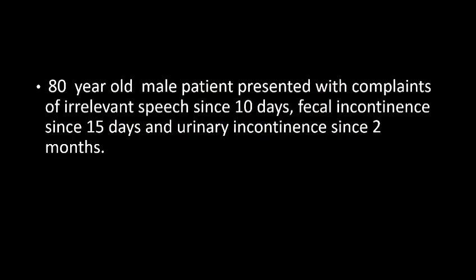Good evening everyone. Today we'll be discussing a case. An 80-year-old male patient presented with complaints of irrelevant speech since 10 days, fecal incontinence since 15 days and urinary incontinence since 2 months. MRI brain was done.